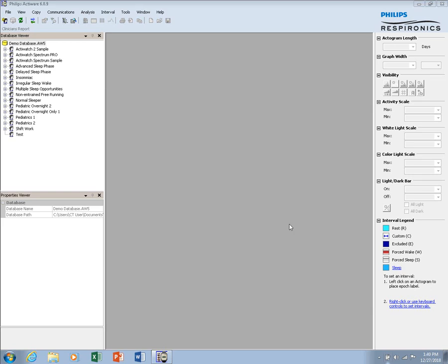In this tutorial, we're going to discuss how to download the Actiwatch Spectrum Pro and Plus devices. In the previous video, we showed you how to configure a device to collect data. In this video, we will assume that the subject has been wearing the device and has now returned to have some data retrieved or downloaded.